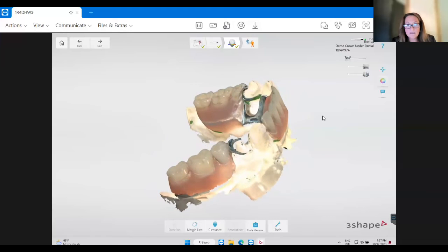As you can see, with either of those other scans, like if the tooth wasn't broken down, or even if you built it up to fit the partial and then did the pre-op scan, they would then put all those files together. So it would show what the existing tooth looked like.